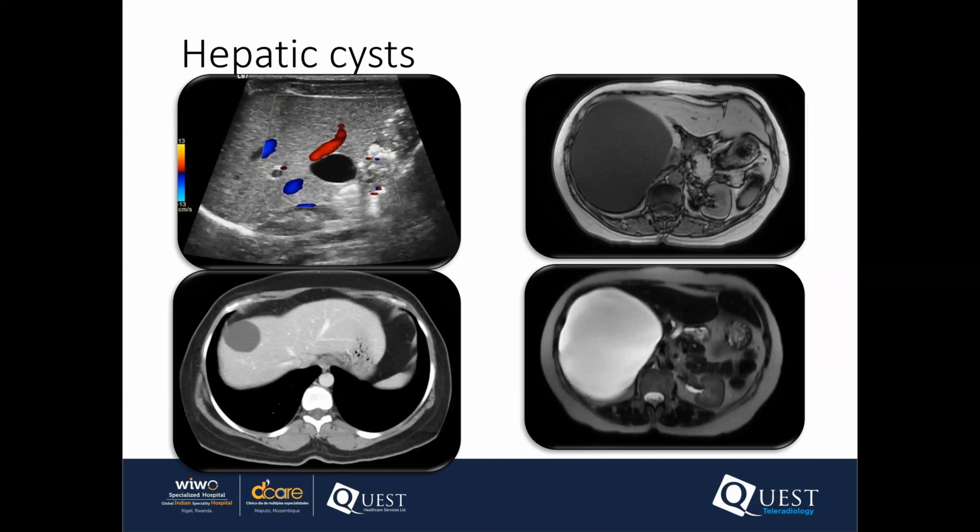The liver cyst on ultrasound is a common feature, and almost everyone who is practicing ultrasound would have seen many cases of liver cysts. On ultrasound, a liver cyst is a completely benign lesion, so it contains fluid of water consistency.